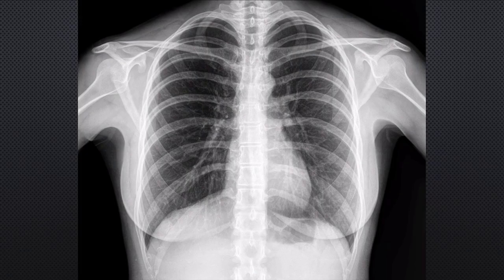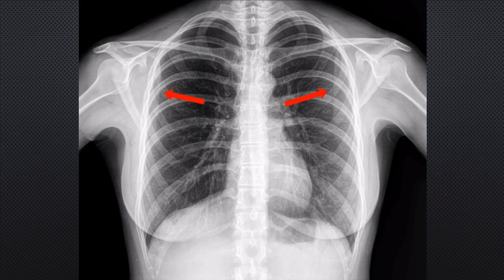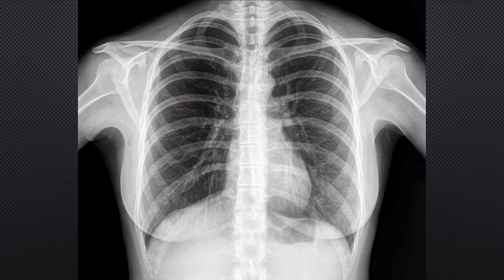The shoulders were rolled forward, which moves the shadow of the scapula laterally almost out of the lung field to give us the best visualization of the lungs. Along the midline of the upper chest, we see the trachea appearing as an area of decreased density projecting over the spine. The trachea bifurcates at the level of the carina into the right mainstem and left mainstem bronchi. This is helpful anatomy of which to be aware in the setting of endotracheal tube placement.